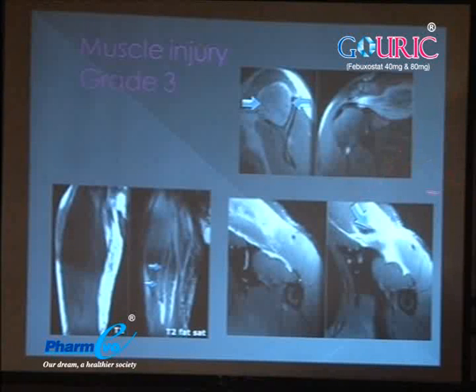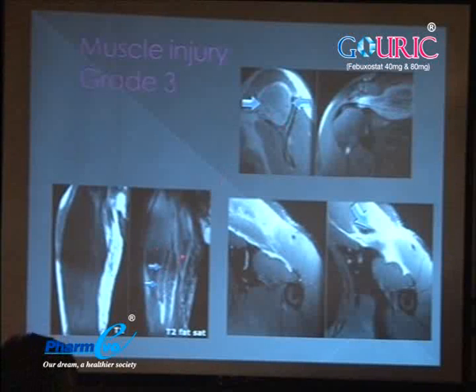When you would use an MRI, you see this tendon is high signal, it is contracted, there's a very big mass-like thing over here. This is a ruptured muscle. And there again, this is a very small, shrunken, contracted muscle because it has lost its continuity. And again, a big muscle tear, complete muscle tear. You see that this is discontinuous here.